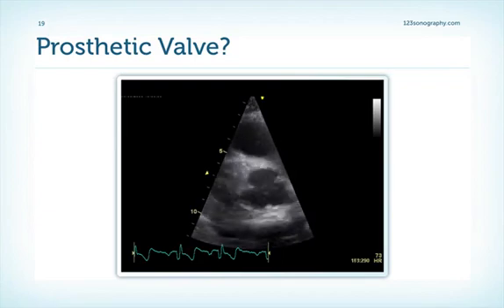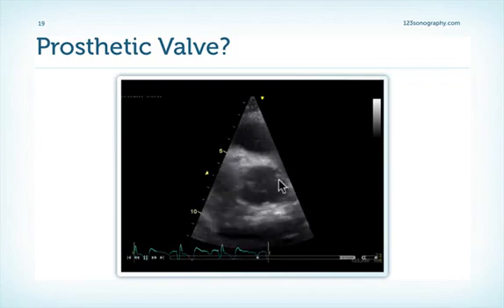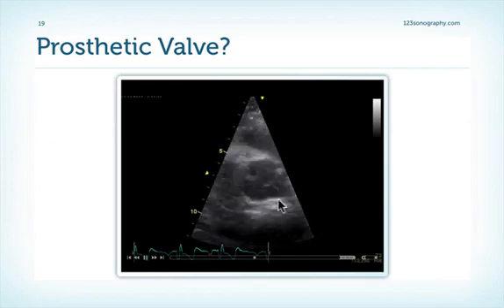Here's a question for you. Does the patient have a prosthetic valve? Well, there is no metallic substance here. We don't have any shadowing here.